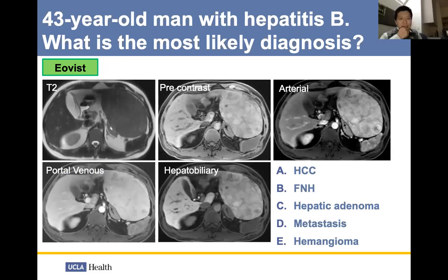This is an interesting case. So there, I don't see a liver lesion. Am I missing something? There's a splenic lesion. You're not alone in that. The fellow from 2 years ago also thought that was a spleen or something.